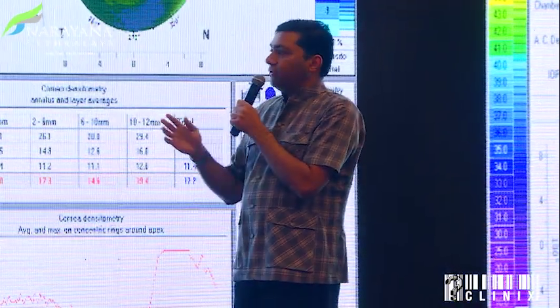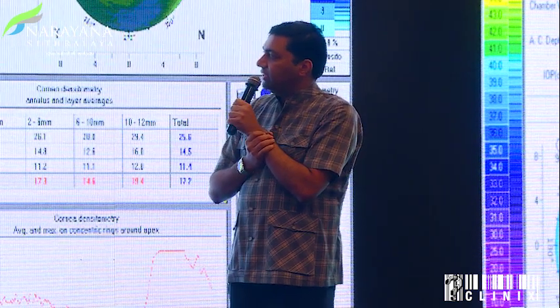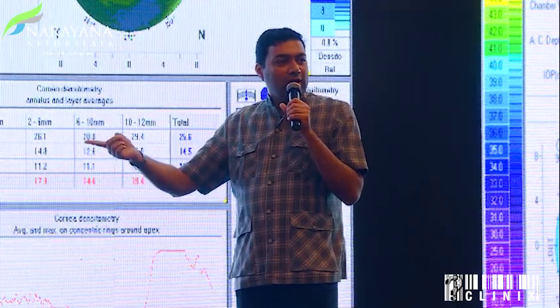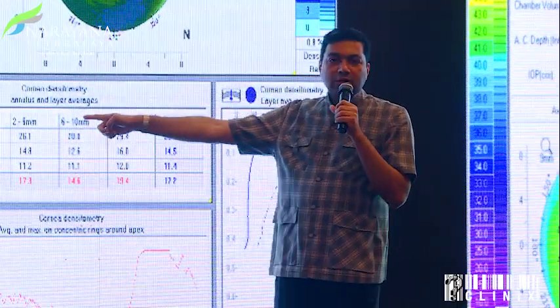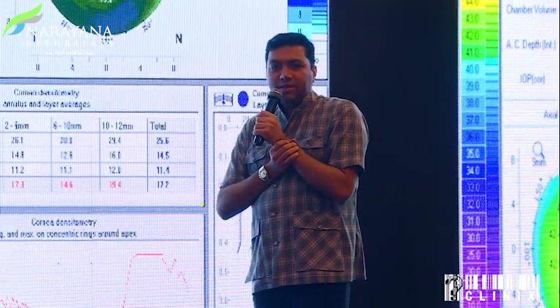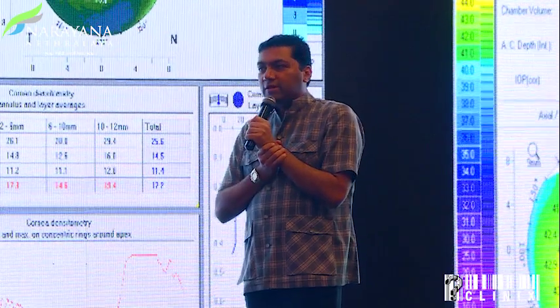I've never used this, but I will definitely try to see it. That means it's giving you a change of percentage. So if you look at it from pre-op and post-op, I think you probably get something similar to this, but I may be wrong, and we'll have to check. Basically it is there, it's hidden there, and you can probably use this.